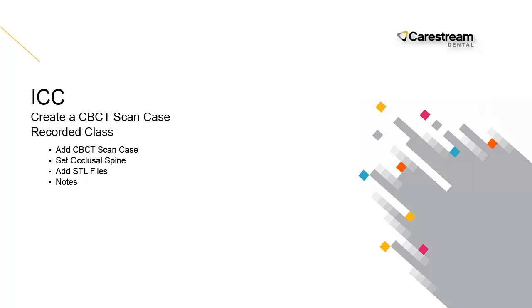ICC. Create a CBCT Scan case, recorded class. This recorded class is designed for clinical team members. It provides instruction on how to create a CBCT Scan case in ICC using DICOM and upper and lower STL files.